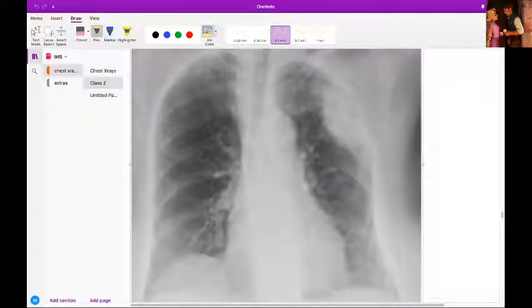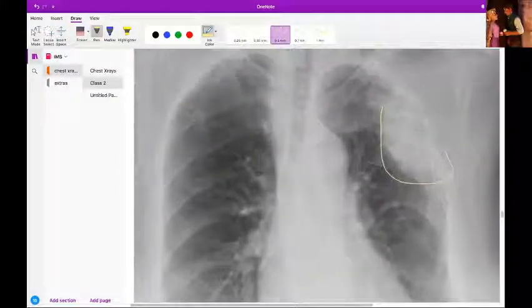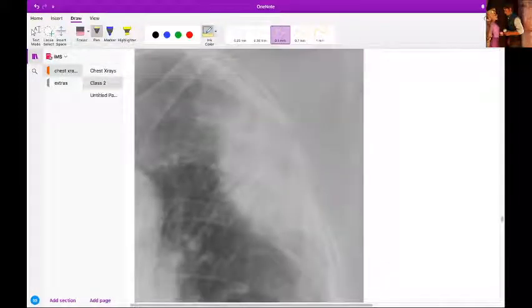Yeah, there is a nodule in the left upper. Okay, and actually, let's just go to the next. Yeah, okay, so there is this nodule opacity in the left upper lobe, and there is also destruction of the ribs adjacent to it. Okay, so this is features of malignancy.